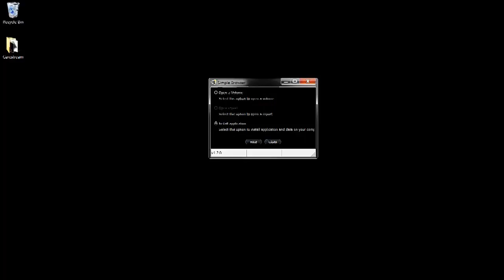Opening the scan from the CD is good if you just want to have a look at the scan and do some measurements, but to have all of the features and functionality of the 3D software, it's better to install to your computer. Please note that if your computer meets the minimum requirements, when you install from the disk, you will see a three-dimensional rendering. If you only view from the CD, you will not have a 3D view.